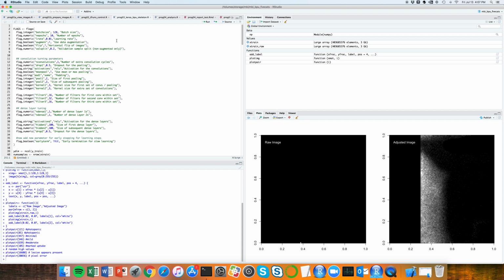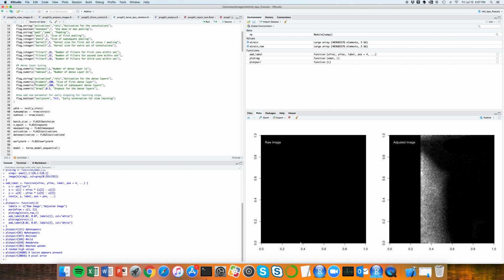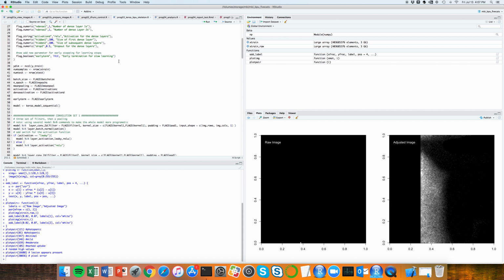That skeleton looks like this. It's a very efficient coding framework. So what you end up doing is you define variables that you want to be passed and permuted from model to model. You go through, you make the definitions, you can specify default values if you'd like. I'm passing through values and trying to fully specify the parameters just to keep it clear in my mind what the individual model was doing.